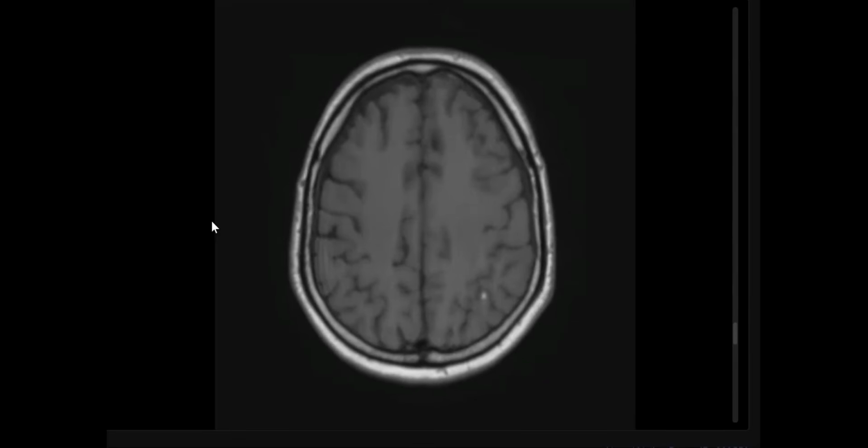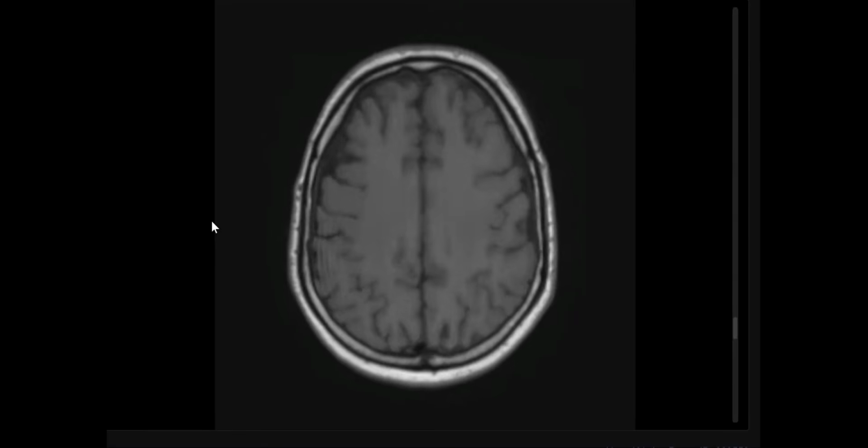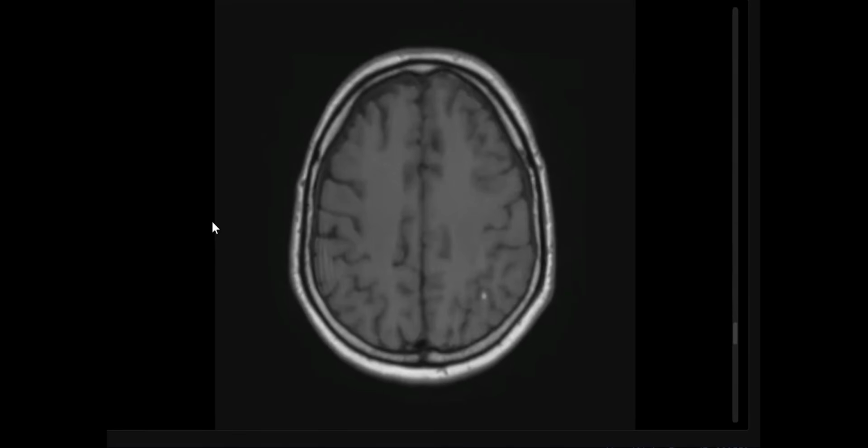Good. So I think this hyperintense signal could be either fatty signal or blood signal. I shall compare it on the T2 weighted images. Why did you put fat first? I thought blood is maybe okay. Blood is okay.